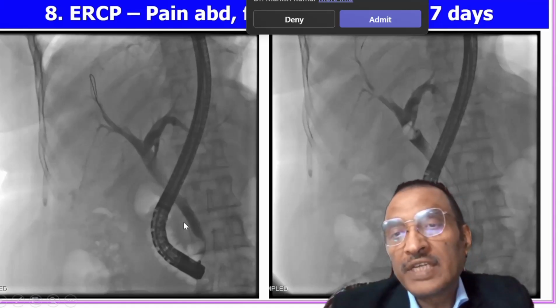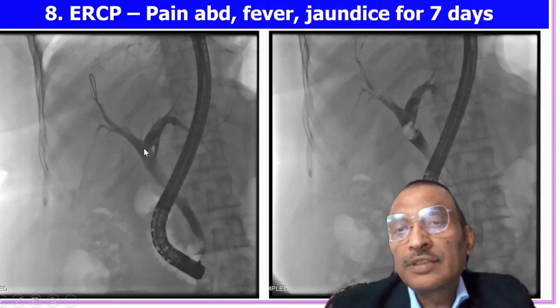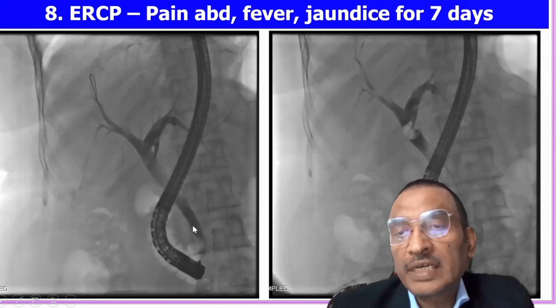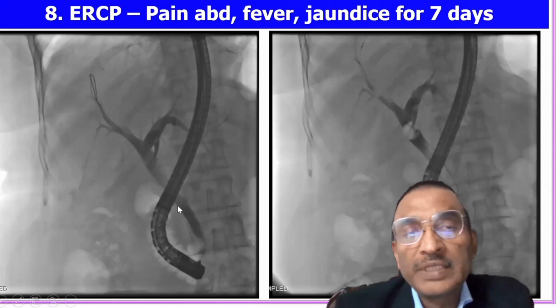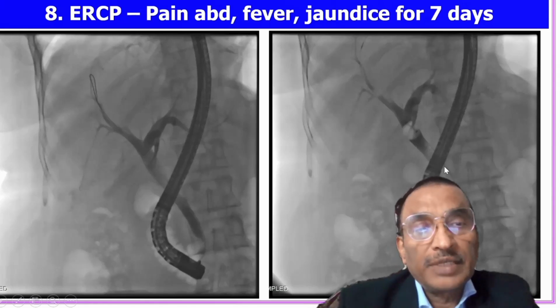So if you give very dense contrast, then like in this patient, you are seeing that there appears to be no filling defect. So that will be paradoxical, but the CBD appears prominent, considering this is 12 millimeter. This appears to be around 8 9 millimeter. So paradoxical.